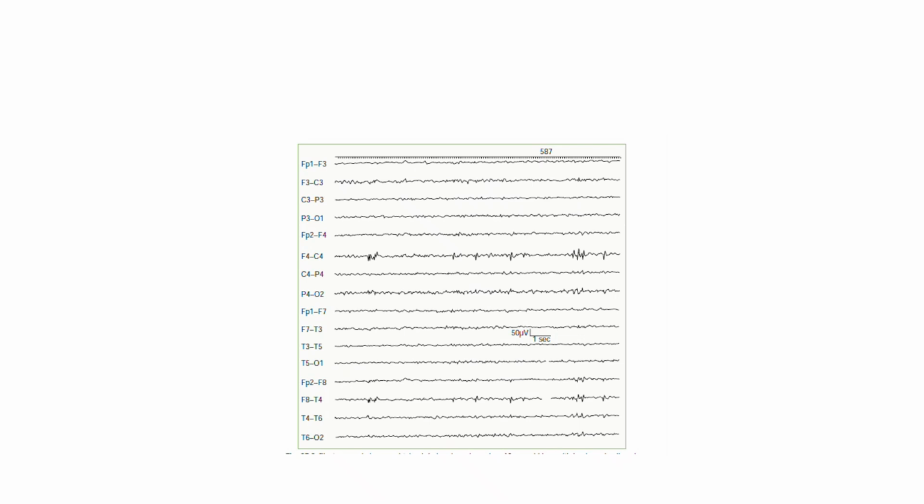This electroencephalogram, EEG, demonstrates the classic neurophysiological hallmark of benign Rolandic epilepsy, BRE, also known as benign epilepsy with centrotemporal spikes, BECTS. Here is a clinical breakdown of what is happening in this tracing. 1. The core waveform pathology. The image captures stereotypical diphasic or triphasic sharp waves, centrotemporal spikes. These are high-voltage, brief disruptions to the background rhythm. Notice how they characteristically have a sharp, rapid initial deflection followed by a slower wave, often presenting with a prominent negative peak.